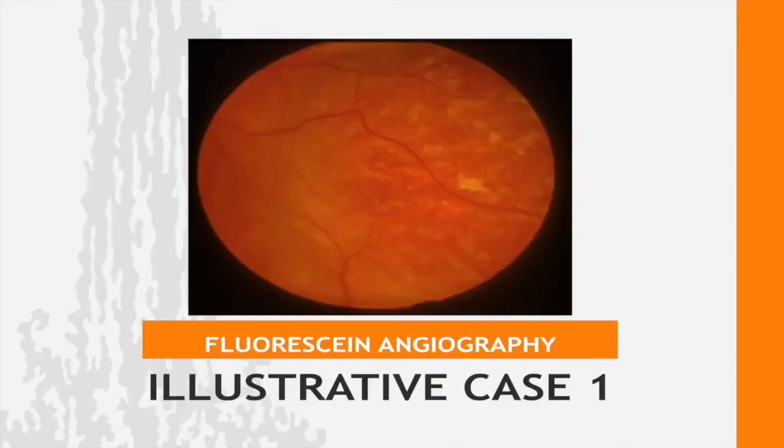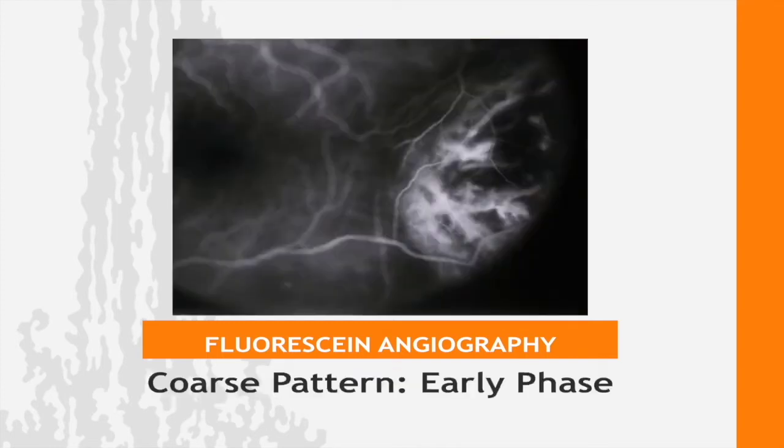So here's a fluorescein. Here we have our hemangioma, the reddish tumor. You can almost see that there are vascular spaces in there, but when you start the angiogram, you can definitely see this coarse vascular pattern. If you remember, the melanoma had almost tube-like blood vessels, and the metastatic lesion just sort of leaked, had very poorly formed vessels. But the hemangioma has jagged and well-formed vessels.